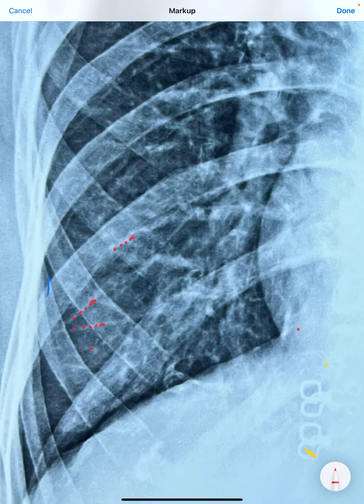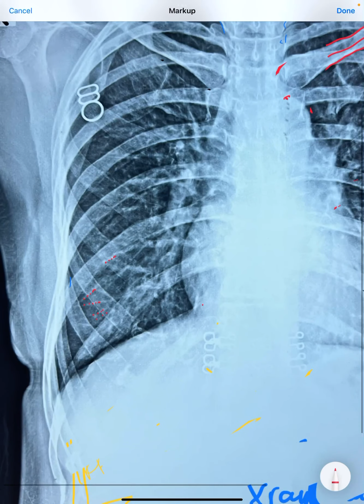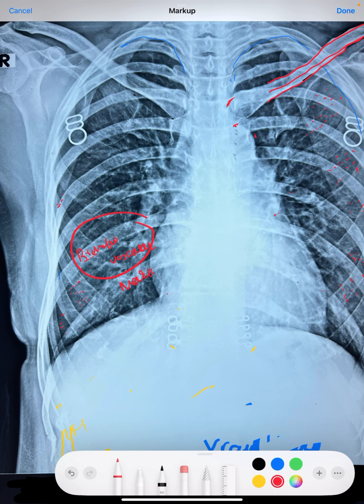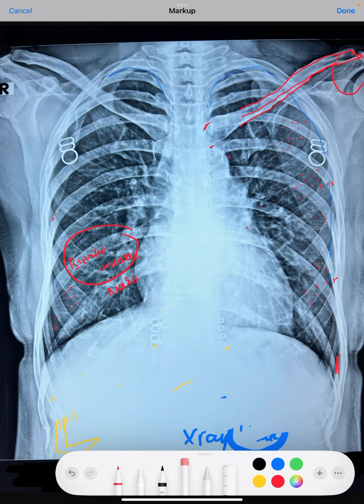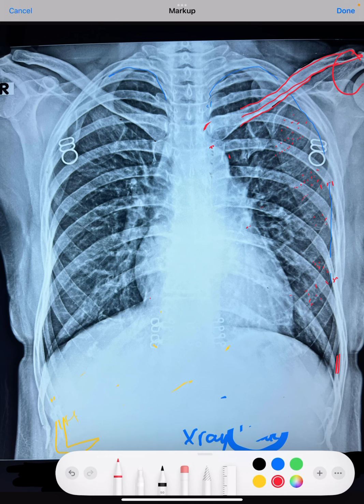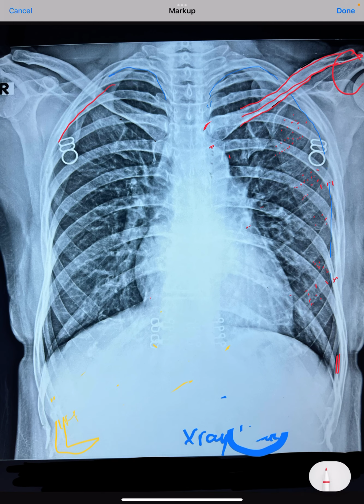These are all part of the normal bronchovascular pattern or bronchovascular markings of the lung. So you can trace this up to the most distal part, up to the ribs. It means the lung is present there. These fine reticular whitish radio-opaque lines should be traceable up to the rib. If they're traceable up to the rib, it means the lung is present up to here.